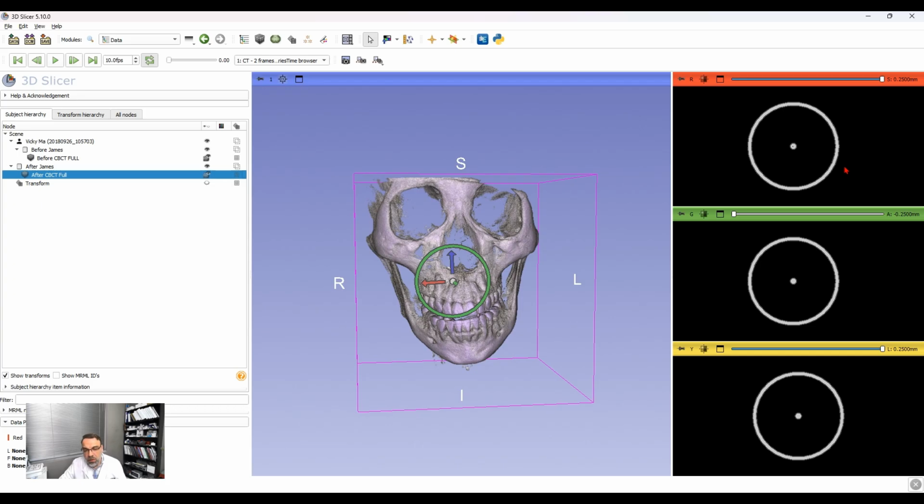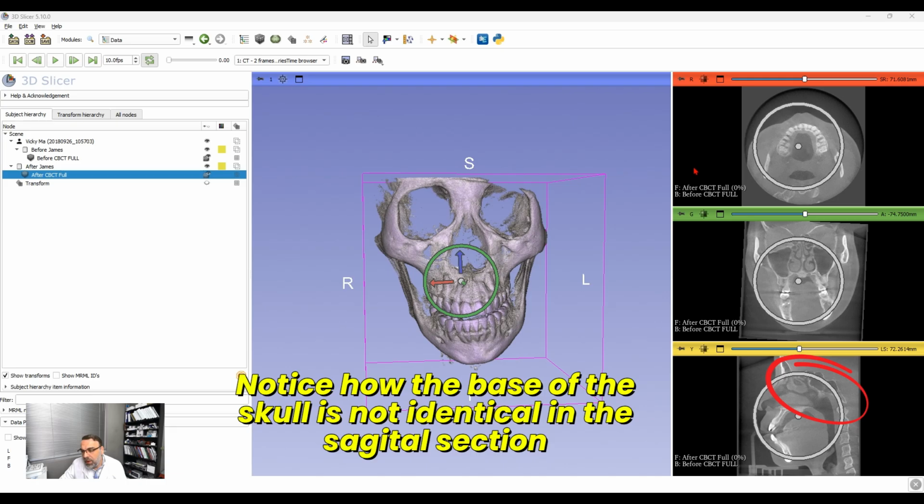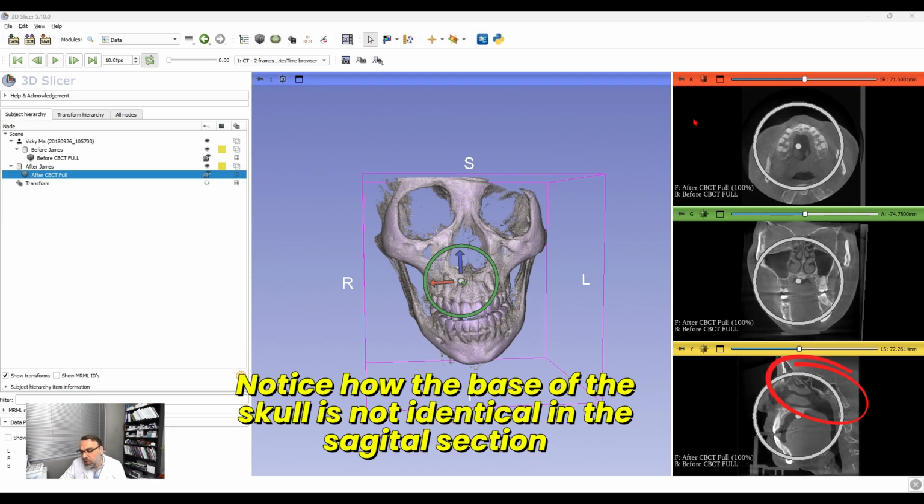Okay. Now let's see. Okay, it's not that bad. Hopefully it will work. Now let's see. Okay. Now I can see this one here. And for having some fun, go here, click this one. So we'll put after here, I do the before here. Then I can see we are close, but you can see we're not there yet. Okay.